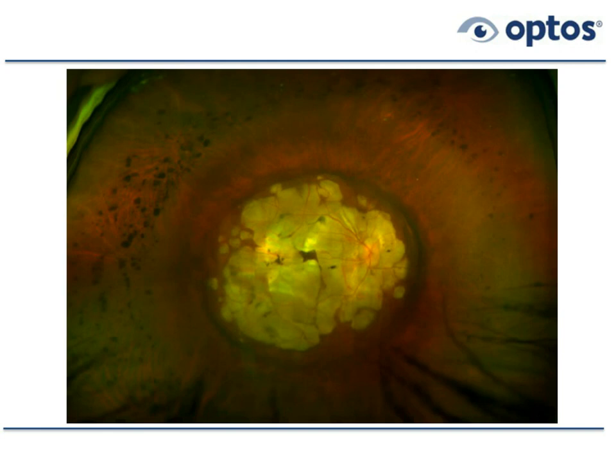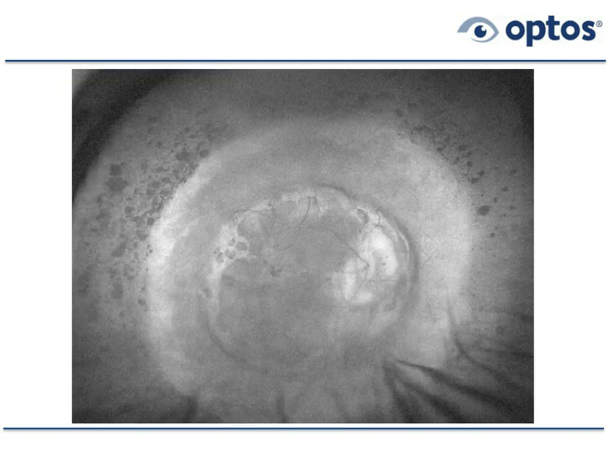And we can see a lot of sclera in the posterior pole, and then there's a ring around that and a further ring. So when we do autofluorescence, perhaps it's not that unusual that we're getting some rings. So this is a patient that has these rings secondary to multiple posterior staphylomas at different levels, which are going further back. And you can see that with the 3D MRIs that we have.